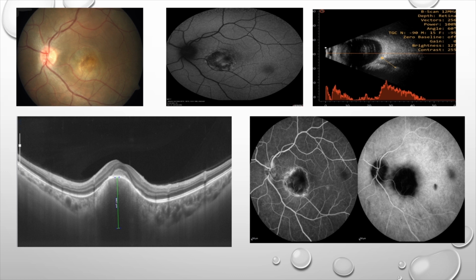May I ask a question, Suganeswari? Yes, ma'am. Owais, I want to know how you measured the height of the tumor on the OCT. What made you pick that lower point in this image? Ma'am, they said that we have to take an estimate of the choroidoscleral junction, ma'am. We took an estimate of the junction of the choroid and the sclera, ma'am. How did you get that estimate in this patient? Because I'm trying to understand from the time your first slide came up how you picked that point.